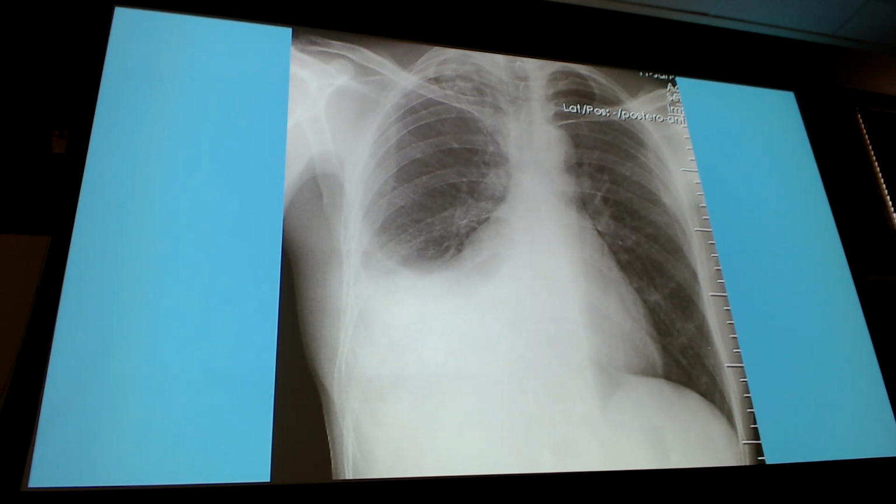For those of you that are looking at it, do I have some? Maybe. Right? Do I have some cephalization here? Maybe. It's all kind of the same density. When I come over here, it's not getting darker as I go up, right? So I might be able to call this some cephalization potentially because of looking at that density kind of going up. It doesn't get significantly darker as I go. So that's a possibility as well.